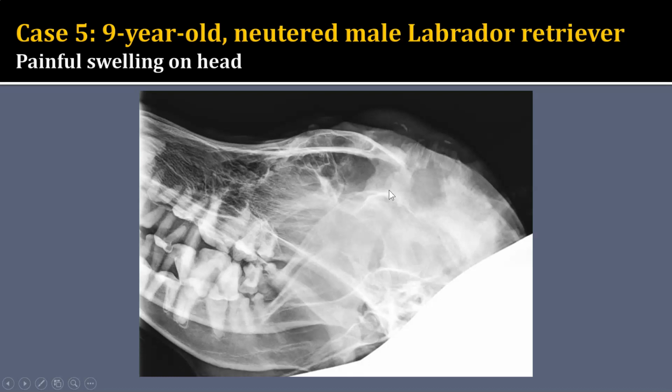But the other possibility would be that this could be a soft tissue neoplasm, like a squamous cell carcinoma or some undifferentiated sarcoma that has secondary osseous involvement. I think it is highly unlikely that this is some sort of fungal osteomyelitis, but ultimately, as we know with most radiographic findings, we can never be conclusive on the underlying pathology, and so we would need to get a biopsy.